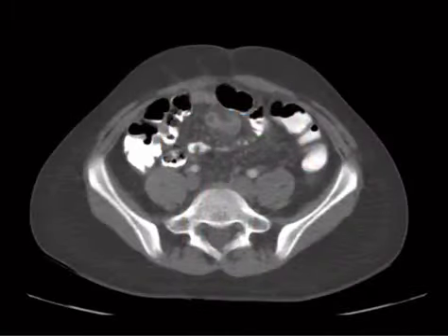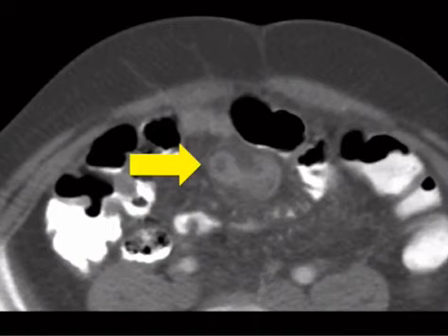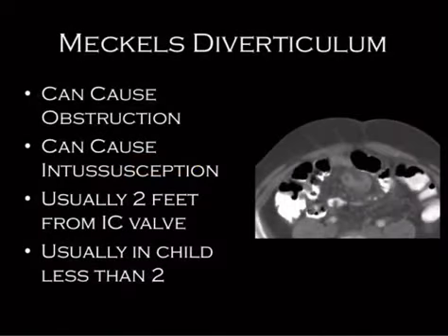All right, next case. So I'll tell you that this kid has abdominal pain and that you see this on CT. Zoom in. I will also tell you that you scrolled up and down and you saw the appendix and it was normal. So this is the Meckel's diverticulum, which can get Meckel's diverticulitis. These can cause obstruction. They can act as a lead point. When do you think about lead points? When it doesn't obey the intussusception rule, which remember is 3 months to 3 years. So early on or later on intussusceptions, you think about lead points.